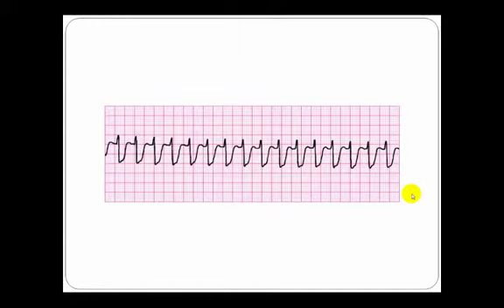This is a wide complex tachycardia, and without understanding axis or looking at a 12 lead, this may be of unknown origin. You might not discern this as Vtach, but it is wide and aberrant. It is also greater than 150 beats per minute. So, very simply, if it's a wide complex tachycardia and it's greater than 150 beats per minute, and you think that the cardiac symptoms are being caused by this, you should probably correct it.